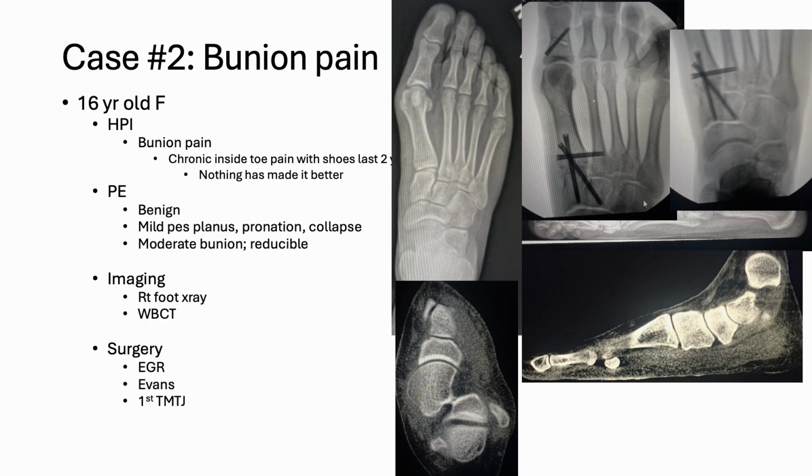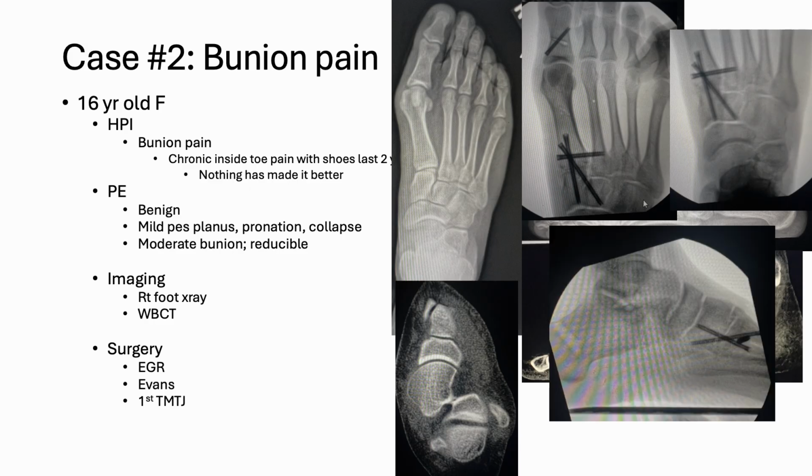That's what the hindfoot looks like. Based on the weight-bearing x-rays and the intraoperative films, you really can't tell that I got a bunch of correction. The CT scan would have shown this, but the lateral definitely shows that I elevated the calcaneal inclination. Patient's doing well. She's now a year out. I wish I would have taken some post-operative films. She's doing great. She's very happy that we did the procedure. No major complications.